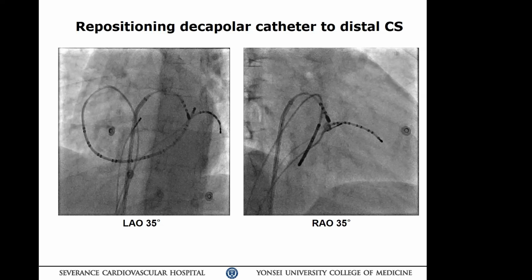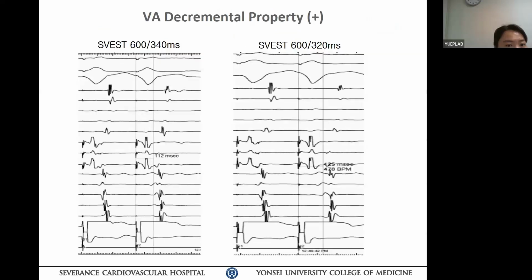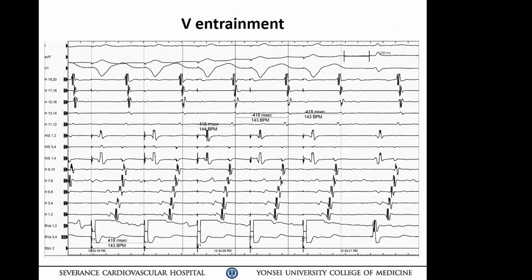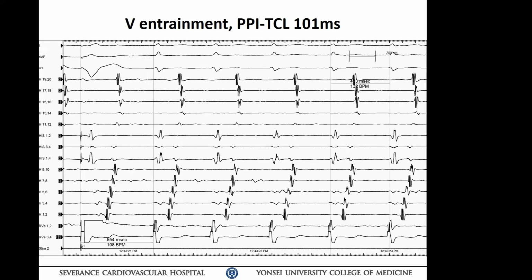Can you show the slide, the overdrive pacing? Hi, Professor Kim. I'm Min Kim from Gangbuk Samsung Hospital. PPI minus TCL, please. Okay, so actually, in this case, the importance is describing the AVNRT with the bystander eccentric lateral pathway, or, as you presented, the dual tachycardia.